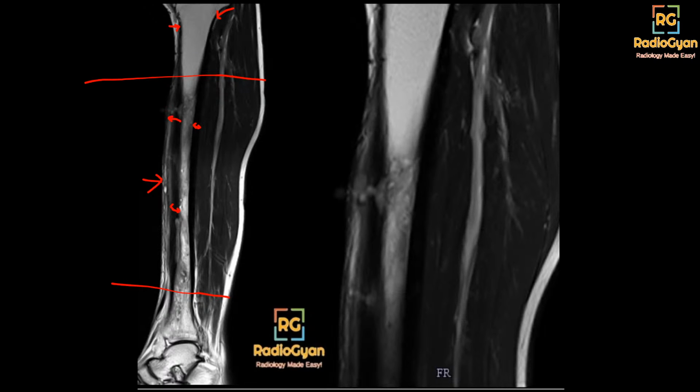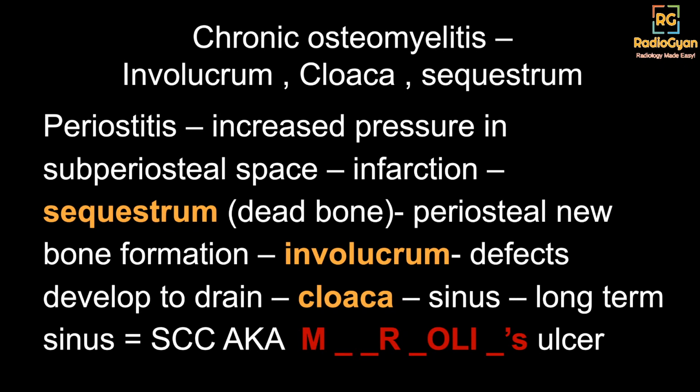This one is not seen well, but at least these two are kind of convincing. So this is chronic osteomyelitis with multiple sinus tracts. So chronic osteomyelitis, there's often a confusion in these terms. So as you know, as the name suggests, it's chronic infection of the bone.